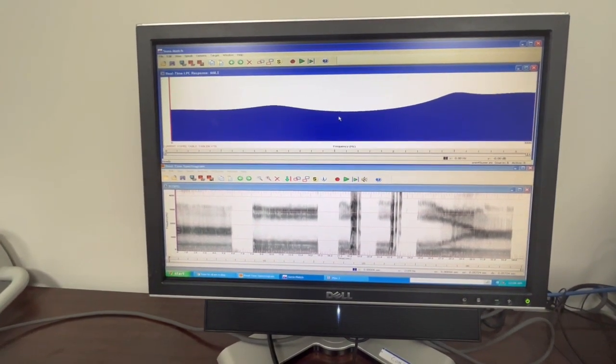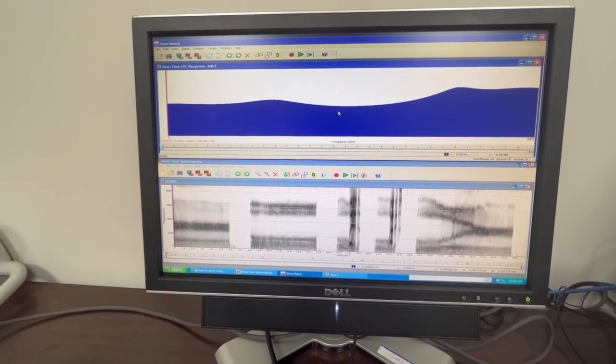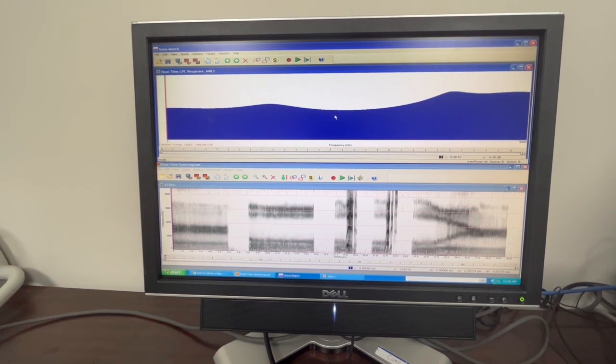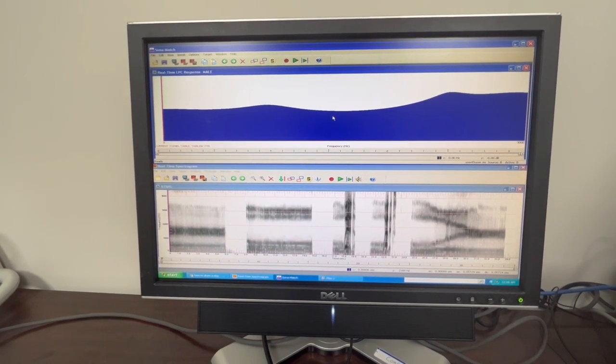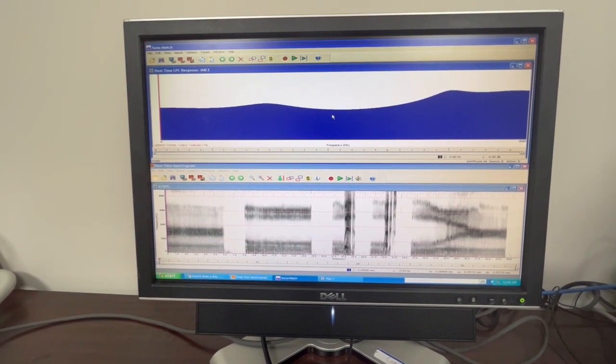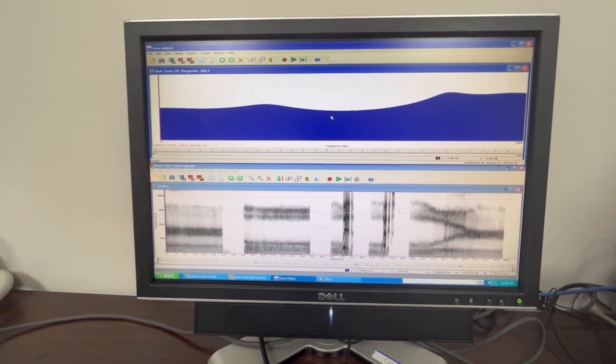But for treating misarticulation of R, we're primarily concerned with being able to clearly identify where formants are. And we want young children to be able to understand and interact with what they're seeing. On both measures, the LPC spectrum is a better choice.